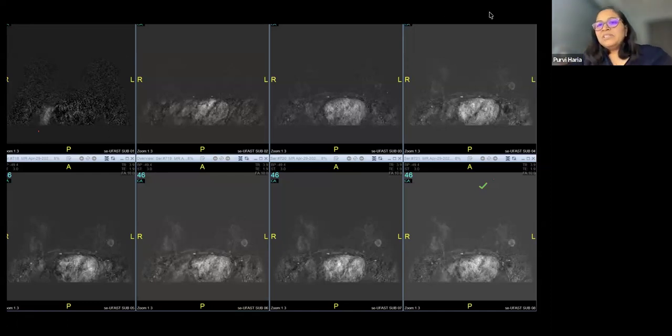So this BPE, no radiologist likes a lot of BPE because it masks a lot of lesions, and we are not happy with that kind of scan. We're not confident to report, or we wonder whether we are missing something. That thing always stays in the back of the mind. So this is what the ultrafast sequence helps us with: before the BPE starts coming in, the lesion has already enhanced, and the washing has happened inside the lesion.